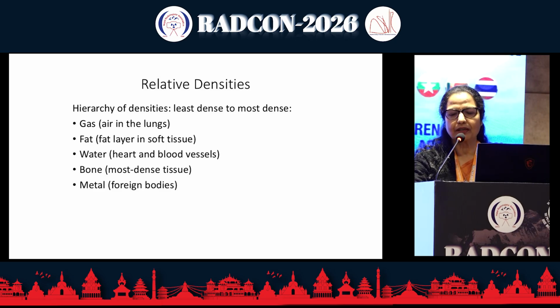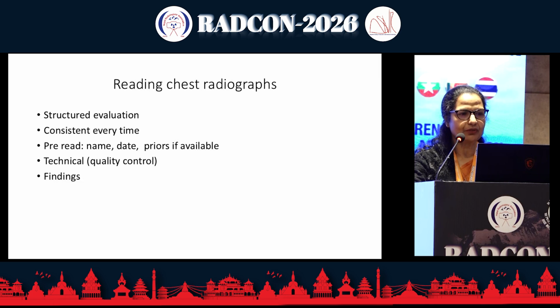So before interpreting the chest radiographs, we have to keep certain things in mind, like structured evaluation. We have to be consistent every time. Before reading it, we make sure that it is for the intended patient and the date is correct, as well as if we have previous radiographs, it becomes helpful for comparison. And we have to see that it is optimally obtained. Technically, the chest radiograph is also good. And finally, we should interpret the findings.